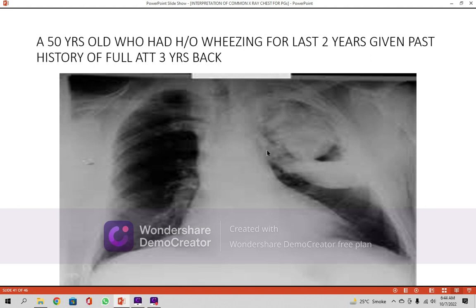So these are the possible differential diagnoses, and benign tumors cannot appear like this because calcification is an important point, and their radio density is much higher than this. It may be a cavitating bronchogenic carcinoma, okay, fine, but this type of picture is not seen with a cavitating bronchogenic carcinoma. If it is, it may be two types: a complete cavitating lesion, or one associated with a fluid level.